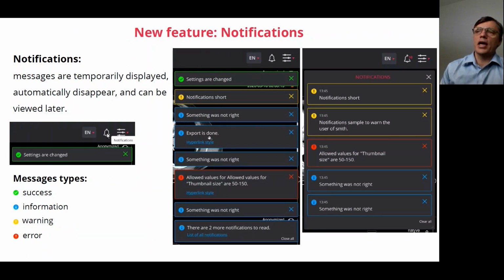Here is the notification. Of course, this notification bar is mainly used only in the worklist and viewing, but this is definitely something we dreamed about a lot, because all these warnings and messages were really annoying to end customers. And now we have created a smart and elegant way to show them without any disturbance for our users.